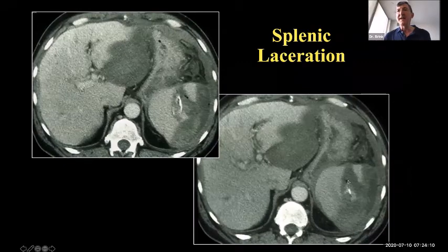Again, remember, not thinking about the fact that that ligament will guide the tube to the splenic hilum, the spleen being a very forgiving organ, split right in two as they advance the tube. And again, highlighting where this hematoma is located. As an added feature, we also see some liquefying hematoma over here. This is anterior to the gastrohepatic ligament being bowed posteriorly.